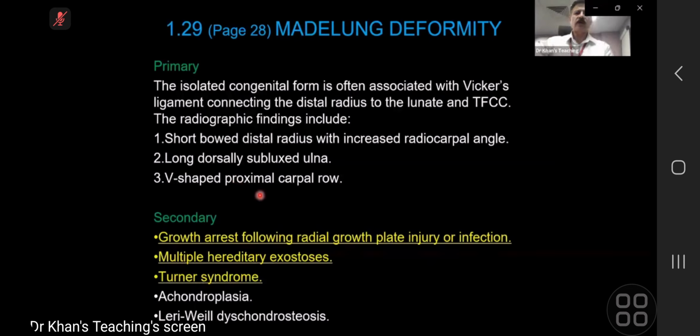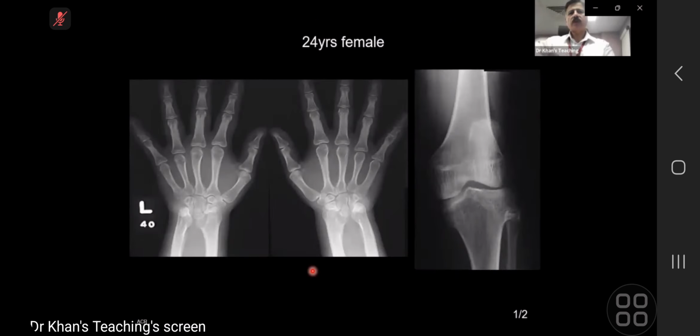You did mention other things in your description. You were ruling out things, and you did well where you ruled out also Turner syndrome. Now, Turner syndrome, if you see this case, candidate 2, this is Turner syndrome. Can you describe and tell me why it is Turner syndrome?